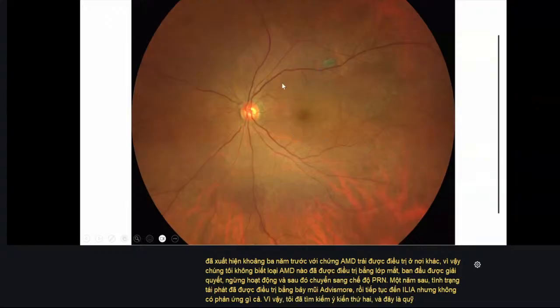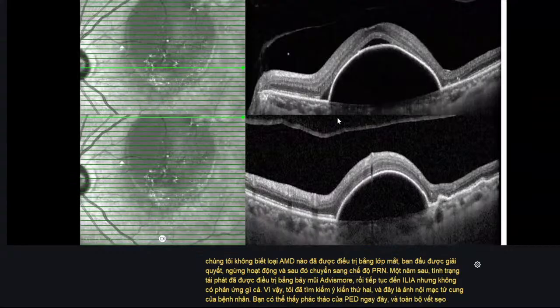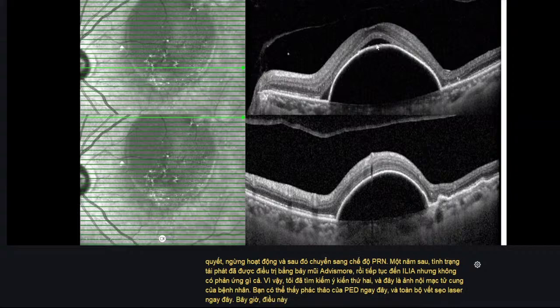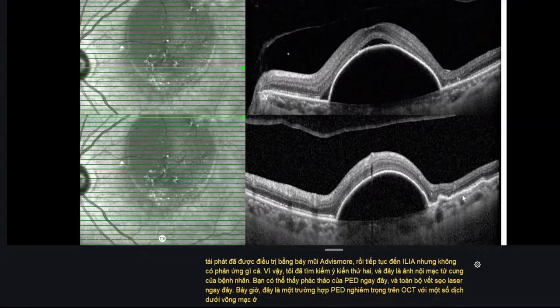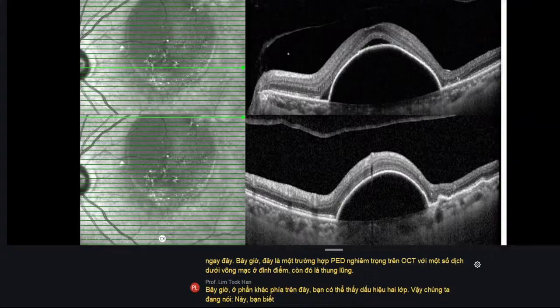You can see the outline of a PED right here and the old laser scar right here. Now this is a serous PED on the OCT with some subretinal fluid at its peak and this valley. Now in another section on top here, you can see a double layer sign. So we are saying, hey, this may be CNV or polypoidal.